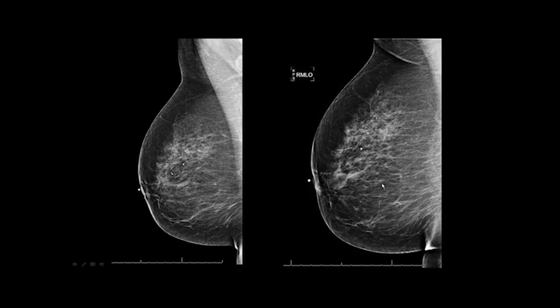All right, here's the same patient, two different technologists. Why is it so extremely different? Well, you can see here, this is a small paddle, this is a large. Remember, there's a different number of pixels for the small paddle and the large paddle.